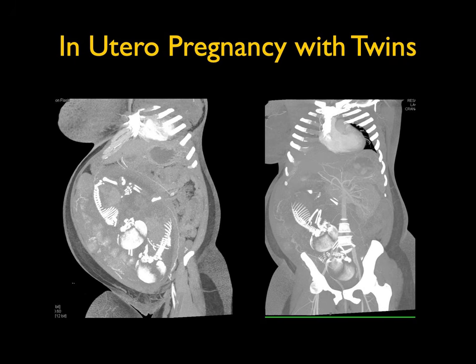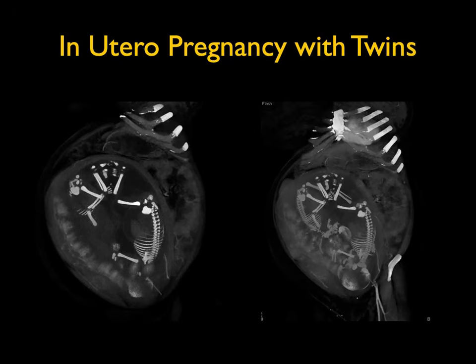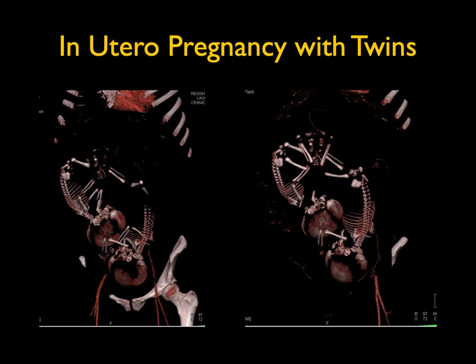And this is just a nice example of a patient who's pregnant with twins. We don't see many cases of twins on CT, and this is just a very nice example. And people always like to see these cases, which is why it's probably so popular.